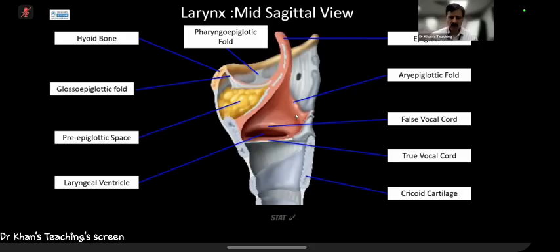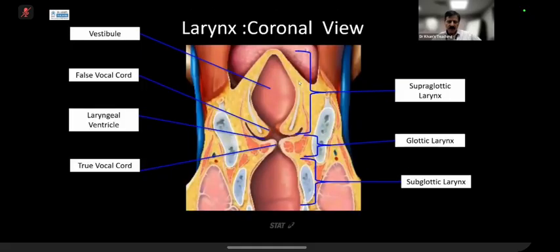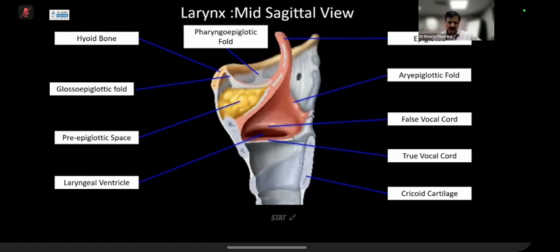So we'll continue with a bit of lecture mode before I show you a few cases. You remember that we learned before the break that the larynx has three portions: glottis, supraglottis, infraglottis. Let's see a few further landmarks. On this, we can see that this is, of course, the thyroid cartilage. This is the arytenoid cartilage. And we can see that this is the true cord level.